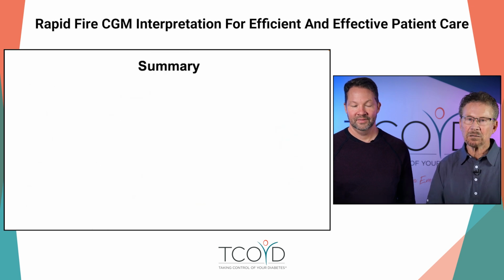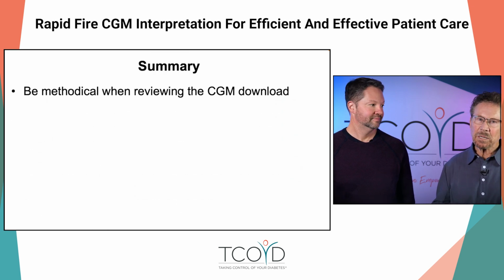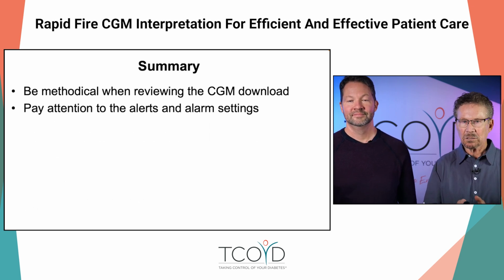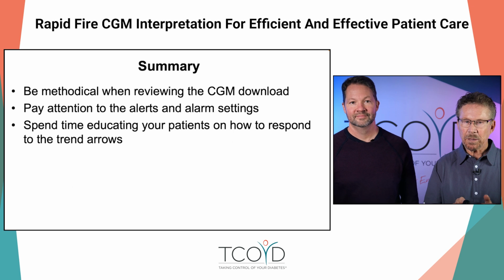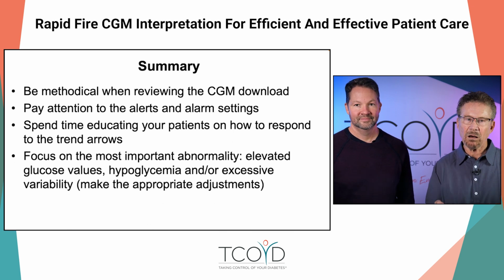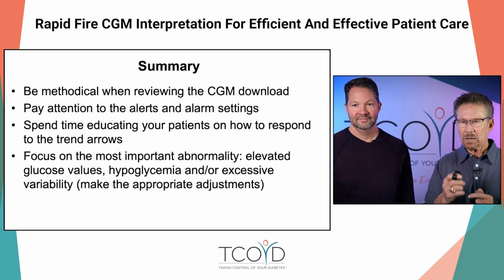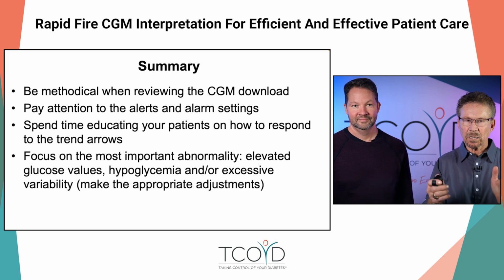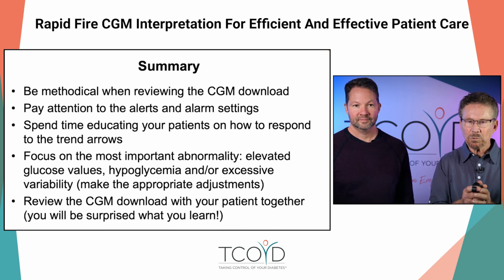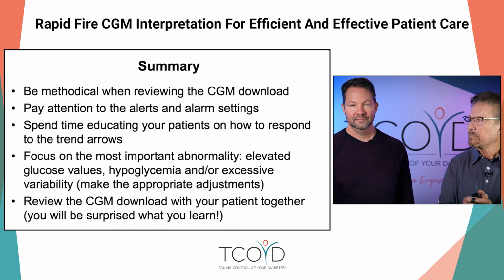That's basically the end of the program. So the summary is: be methodical when reviewing CGM download. Pay attention to the alerts and alarms. Spend time educating your patients on how to respond to the trend arrows. It'll pay off big time. And focus on the most important abnormality: elevated glucose values, hypoglycemia, excessive variability when you look at the downloads, and then focus your visit on the biggest abnormality and review your CGM download with your patients.